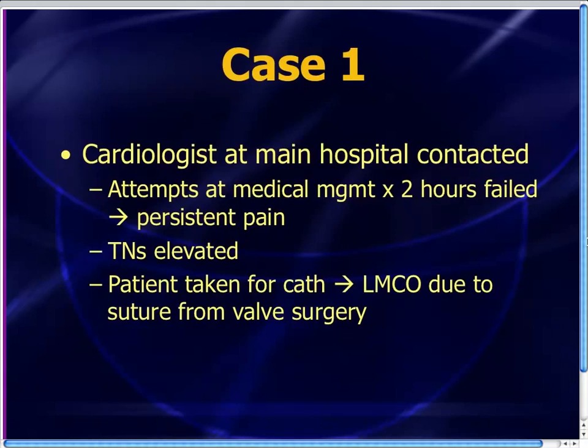So trust that 12-lead EKG when it's combined with concerning symptoms. Who cares if the patient had a clean cath 2 months ago? When there's that degree of new ugliness on that 12-lead EKG, okay, all right, enough of that. When there's that degree of ugliness, you've got to take it seriously.